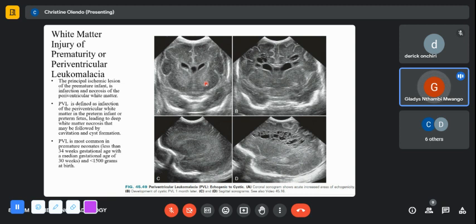Sometimes you might have some infarction, like in that coronal view. It looks like it's extending to the thalami, yeah? But maybe it's just the way the cut is. It's probably just all within the white matter of the temporal lobes. Yeah, could be temporal lobe. It's a bit anterior, so it's not in the thalami. It's more anterior. Okay, that's fine. We can proceed.